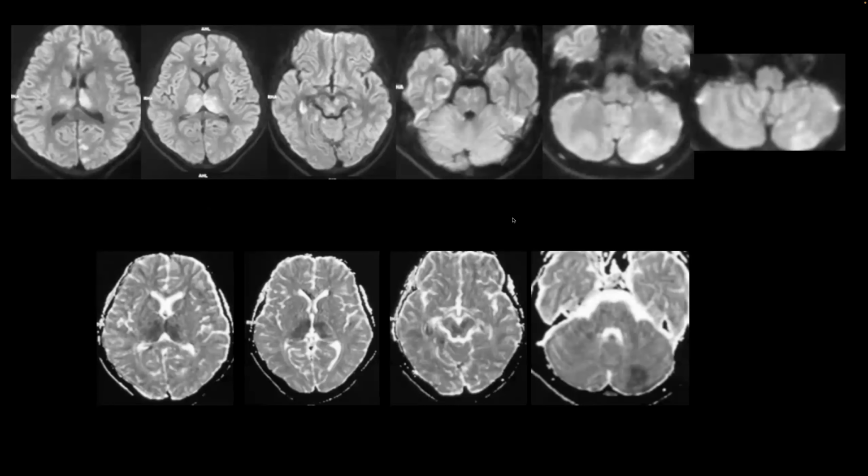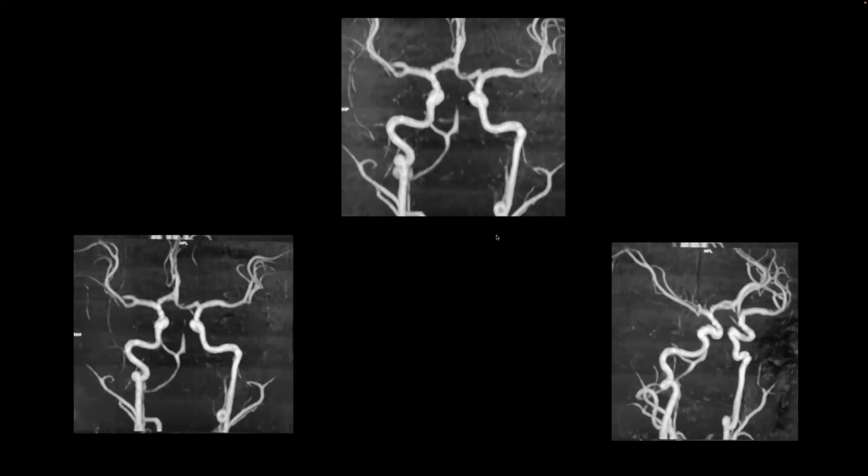This is the one, Devangana? Yes, sir. So MRI showed bilateral cytotoxic edematous changes in the thalami, also involving the occipital lobes, the mesotemporal lobes, areas of the brainstem, the bilateral hippocampi, and also the left cerebellum, demonstrating these areas of cytotoxic injury, with corresponding changes on the ADC sequences, suspecting an ischemic process.